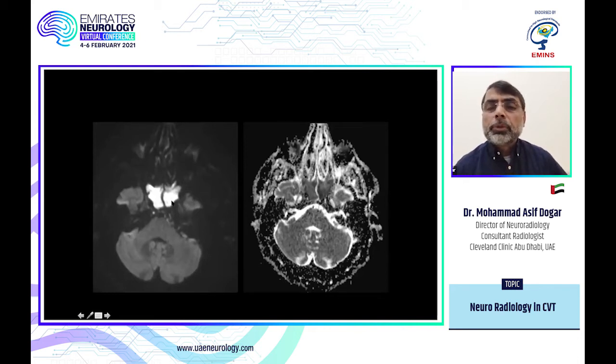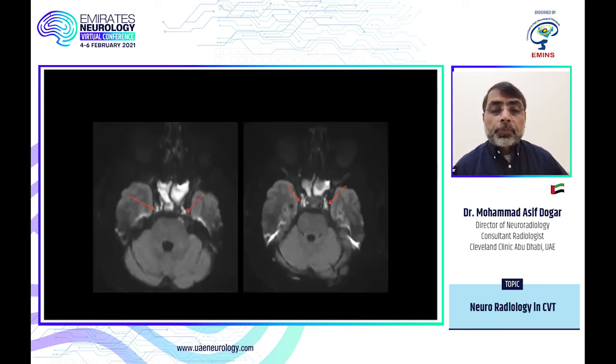So this patient's headache may be due to sinusitis. But if you look at the next image, there is this diffusion restriction where it is in the cavernous sinus. So that is highly suspicious of cavernous sinus thrombosis.